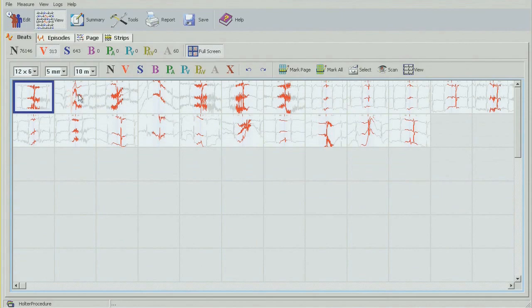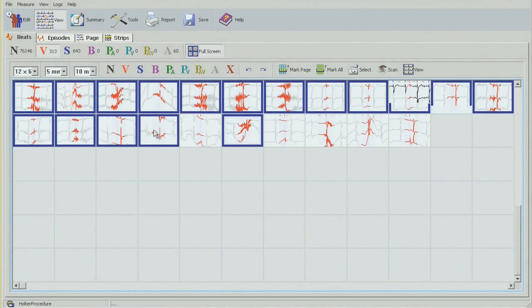This one here, it's on a T wave. There's an actual ventricular beat that's labeled correctly. You can see the little off red color here. So the whole bin is going to be changed into artifact. I can do it from here by marking the page or marking all of these beats by clicking on one and dragging down to as far as I want.